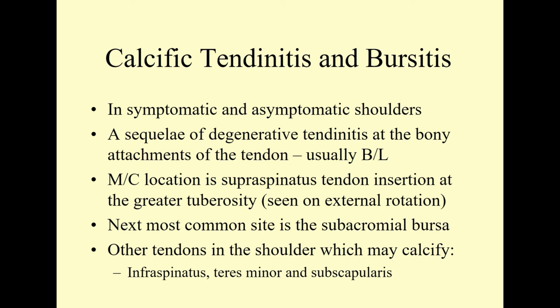We'll talk about HAD, hydroxyapatite deposition disease. So I did want to give us some good examples of calcific tendinitis. The shoulder complex is a particularly rich area for this kind of problem. It usually starts out as a tendinitis, and then it can convert to a tendinosis, and then finally end up with calcification, precipitation within the injured tissue.